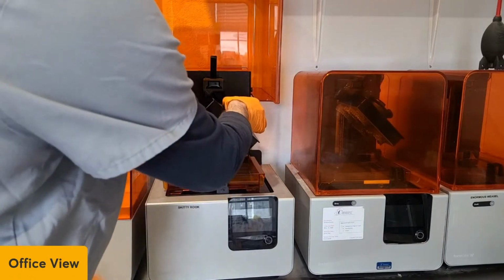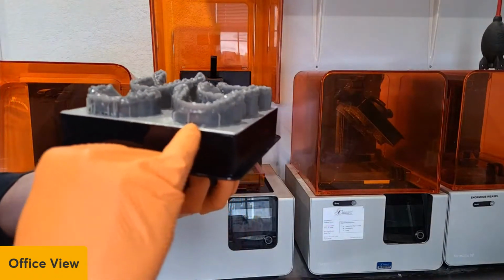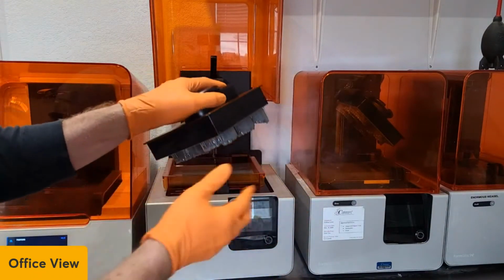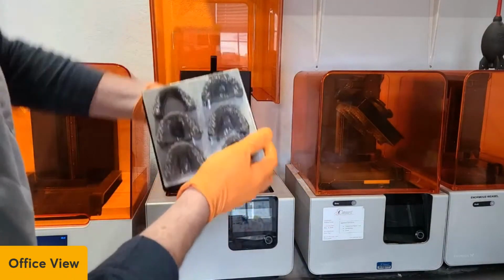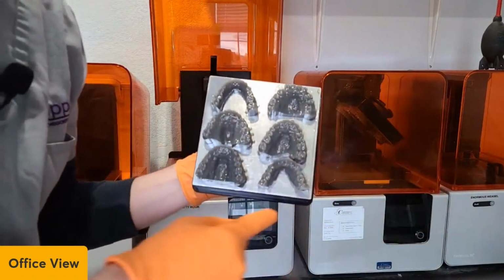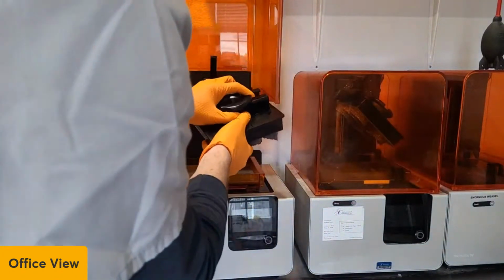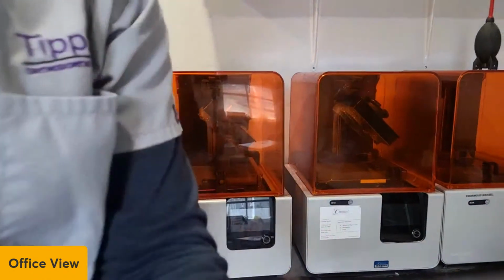Now remember, I just told you that there's drain holes in here. I don't know if you can see that. There's drain holes in the front. So if I rotate this, and I call it the wiper side, if I rotate those to the wiper side and I tilt it, it'll drain like that, and all that on the inside will drain out. But you can see how clean this is because I was able to tilt it. It keeps things clean, in other words. So let me put this back on here and move my little camera stand.